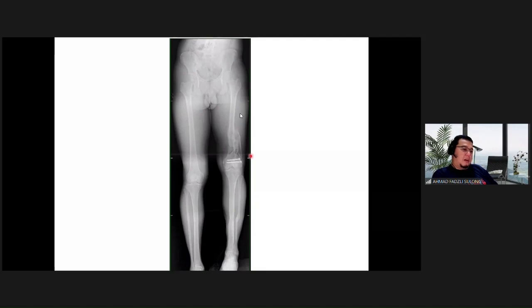Even fresh trauma, katalah kita tunjuk kau dia punya previous X-ray waktu dia mula kena fracture dulu. So you have to describe the fracture. Okay, first the usual name, view, and then ada ke tak fracture, and then what type of fracture that you see, okay, and then the deformity that you can see, right?